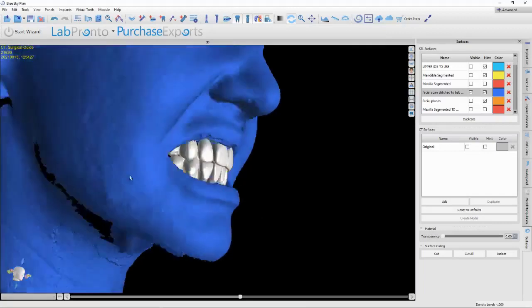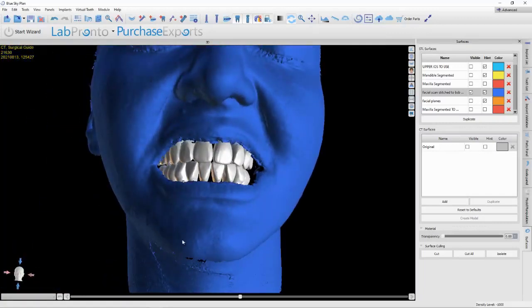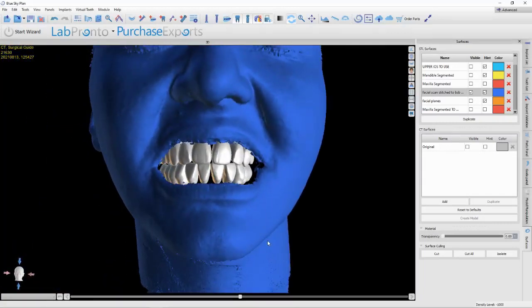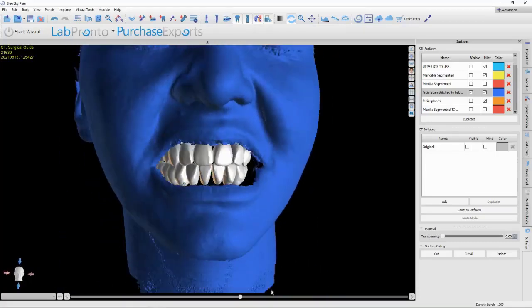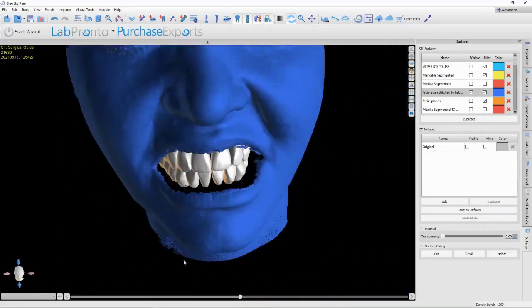So again, I just think this is so valuable to have. Let's look at the overall width. Even though I didn't bring in those planes, I can see distal of that canine, distal of this canine. If anything, if I went back and tweaked this, I might widen back out this side of the arch a little bit, because it looks like I went overboard. Yeah, that's not as symmetric, but that's all things that you could tweak as you go along.